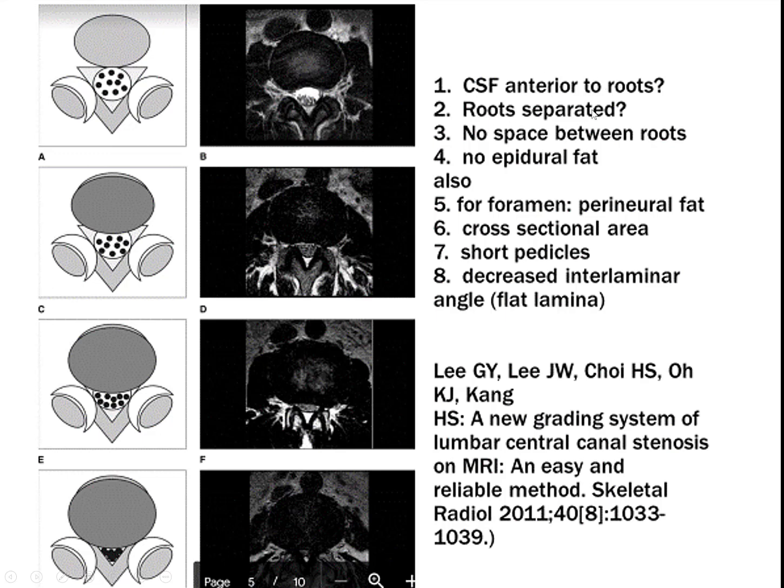Another one is, are the roots separated? You see here the roots are widely separated, and here they're not separated at all. Is there any space between the roots? You can see the individual dots, and here you really can't.